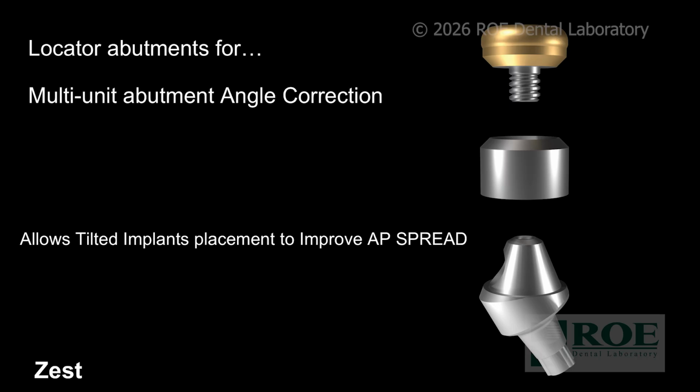And this is that prosthetic, because it looks a little confusing, so I just thought I'd show this. Here's your SRA or MUA for systems other than Straumann, and then this slips over the MUA and the locator screws into the top of that. So it's a clever trick, but I think we can solve these problems more with the angled locators, unless there's an implant that's really off-center, and if it's deep enough, we can use something like this.